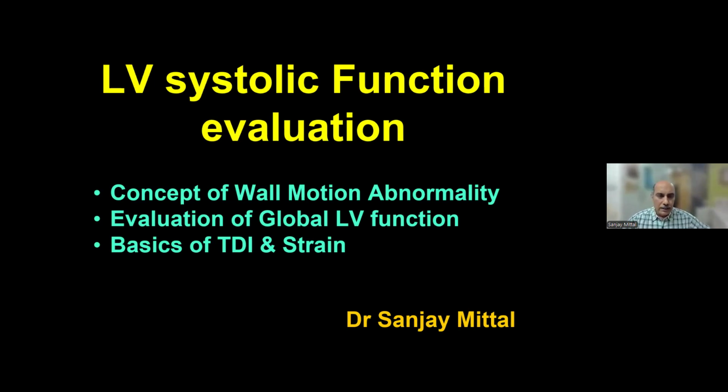Well, let's move on to my lecture, otherwise we'll keep on talking. The things which I'm going to discuss today are going to be basics, the conceptual basics, which are very important. If you have the concepts right, you can utilize them in your clinics. One, I am going to talk to you about regional wall motion abnormalities. Second is the global left ventricular function. And I'm also going to touch base on an aspect of tissue Doppler imaging and strain as I go ahead with the talk.